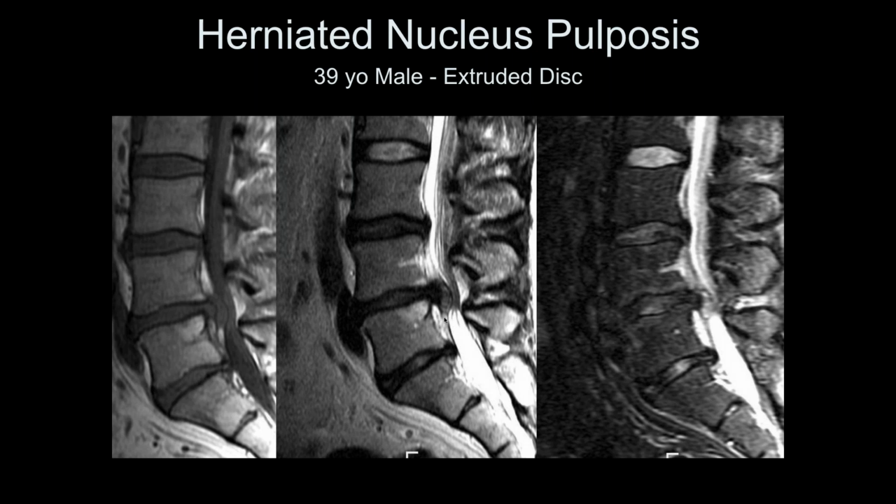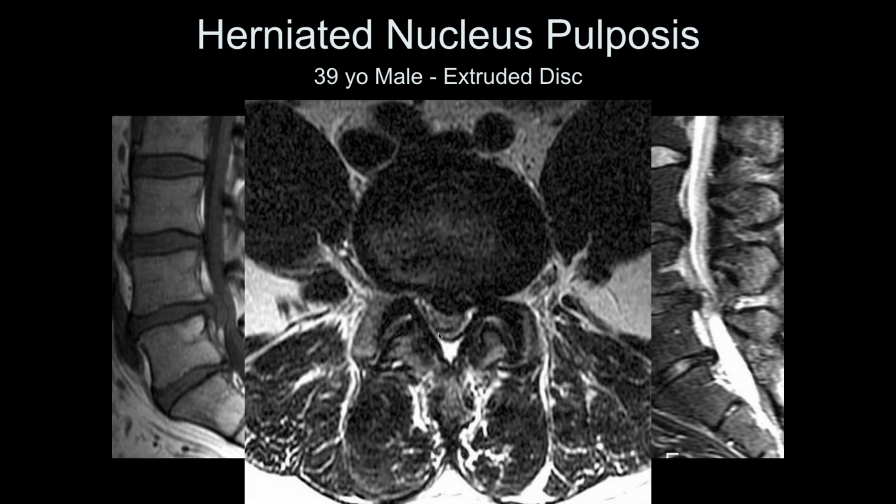This is seen really in acute disc herniations, as I described before. If there's enough fluid in this, the bioactive molecules can produce a severe inflammatory response up and down the spine, which can cause really severe pain. In the axial plane here, we can see some of the more fibrous annular fibers, and this is the extruded nucleus pulposus coming out here, producing marked compromise of the thecal sac and the neural canal.